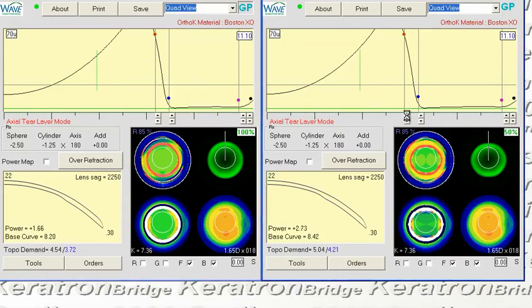So I'm just clicking up. And 3.4. I'm going to go down to the bottom and do the same thing. .44. I'm going to go with 3.37.